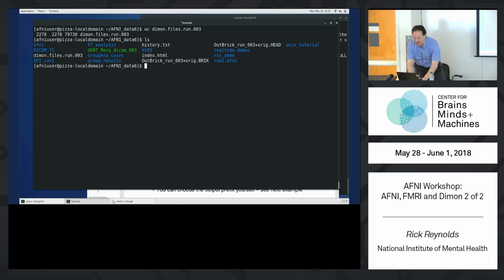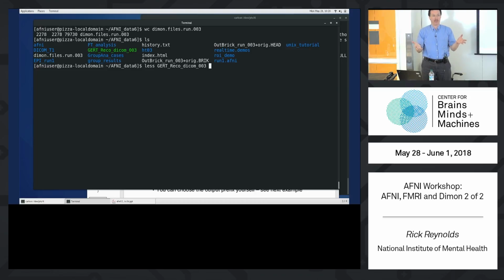And lastly, that script, I can look at it with less. You can't just type open on your Mac, because open won't know that it's a text file and won't know what to do. Since I don't know what editors you all have, we have an AFNI form of it, abusing the Mac command open, that says afni_open -e on some text file.